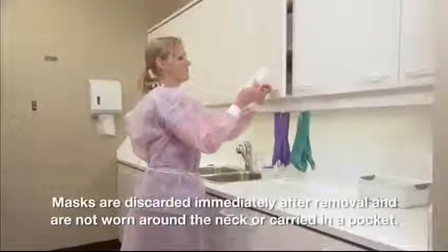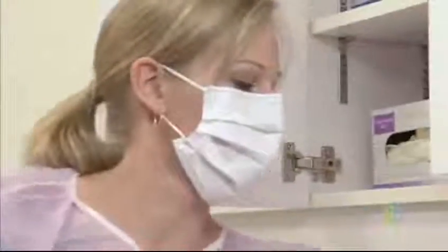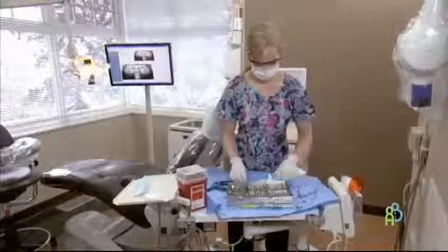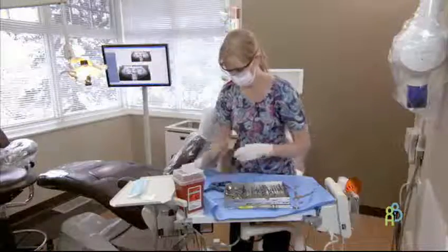Face protection is required whenever there's a risk of splashes or aerosolization. This is most likely to occur during manual cleaning and rinsing of devices. Face protection must provide protection of mucous membranes of the mouth, nose, and eyes. This can be accomplished by using a full face shield or safety glasses or goggles with side protection, and a single-use fluid impervious mask may also be used. Note that personal eyewear provides insufficient protection and is not considered eye protection.